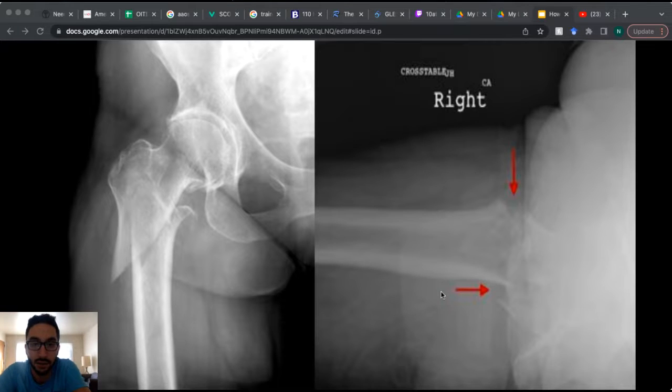I'm not going to go into what makes things stable or unstable. That's a different level here. I'm, again, just teaching how to read X-rays. I'm not teaching intertrochanteric fractures today. So I touched on how many views there are, what the views are, what the structure is, and what the fracture pattern is. And I mentioned it's an unstable fracture, being that it's a reverse obliquity pattern. Those are things you're going to come to know with time as you study more orthopedics. But that was just a quick read of how a read should flow.